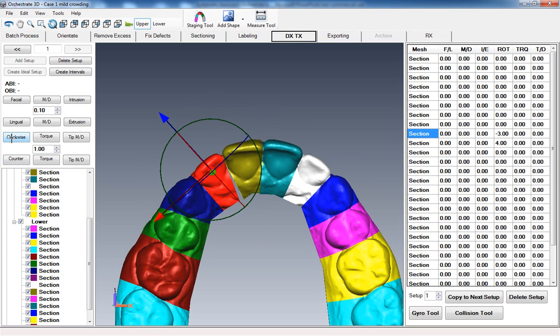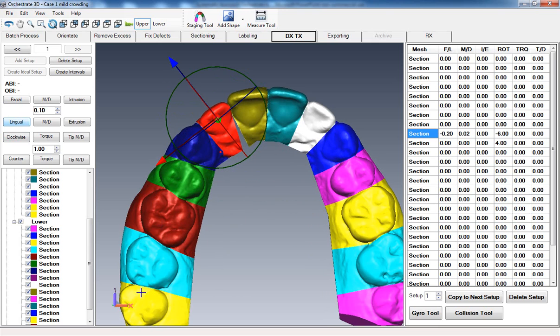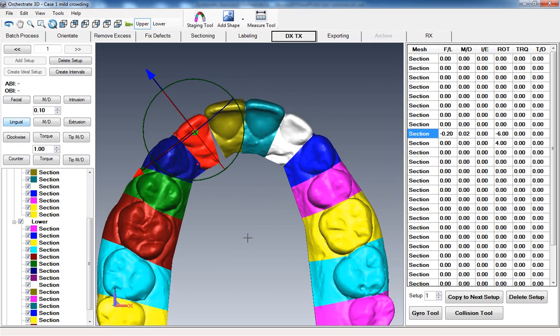lateral, and again, now we go all the way to ideal. We take this case to completion. I'm going to move this lingual just a little bit. And as I look posteriorly, I think everything is okay. No corrections are needed.